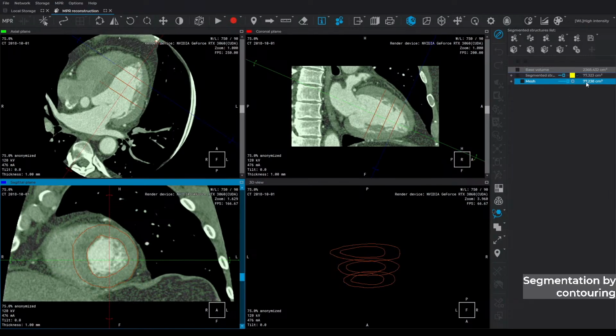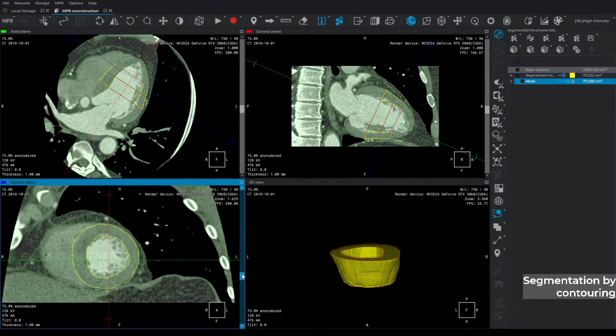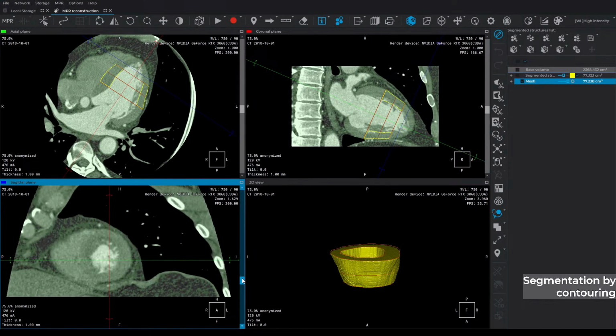This is very nice. I can't wait for you to release this. Yeah, and if you switch the mesh and make it visible, you can see what you're getting here. So it works pretty good as well. I think it can be a great help for you.